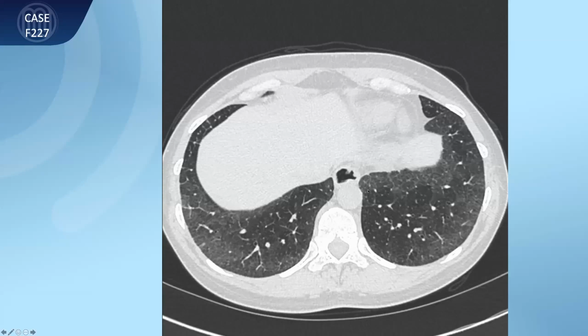However, I can't really tell you or exclude that some of these regions might be just inflammation. But talking from experience, most of these findings are not reversible. You sometimes see that the lung parenchyma looks better in the follow-ups, but if you look closely, you see that the former gray areas become more gray as they retract, and just the rest of the lung parenchyma becomes better aerated. So in effect, what you see here is primarily fibrosis and not inflammation.